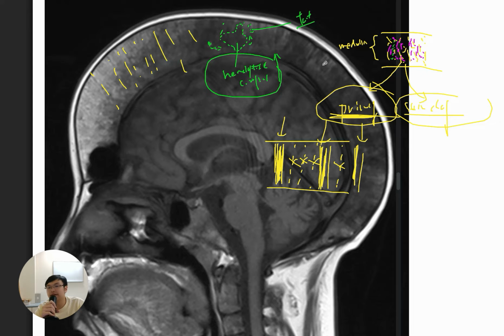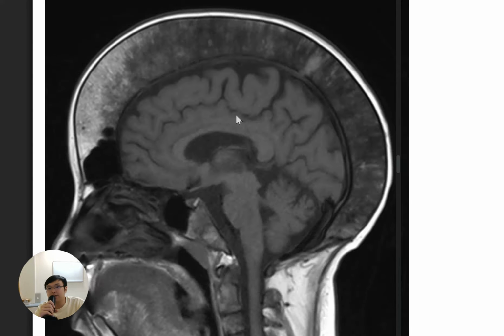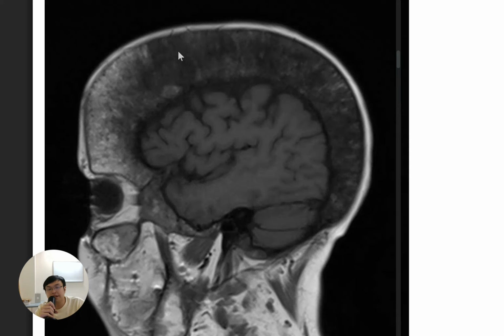That is the underlying pathogenesis. So whenever you have thickened trabeculae, they can even be appreciated on MRI. Why is it that severe? Because in a usual MRI brain, you cannot see the trabeculae, they are too thin. Usually the MRI brain is done in a relatively thick slice, so you should not be able to appreciate the trabeculae unless they are thickened, like here. So you should have this sense in your mind whenever you see them. Basically they are really thickened, and they are really relatively dark.